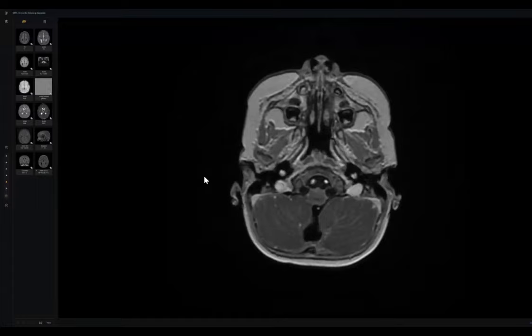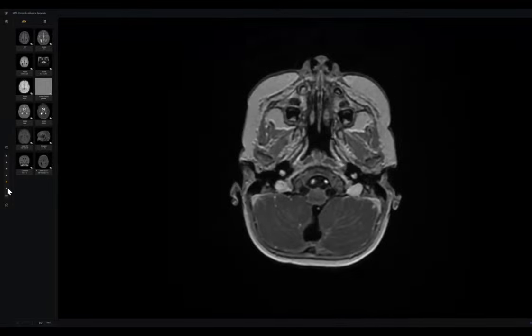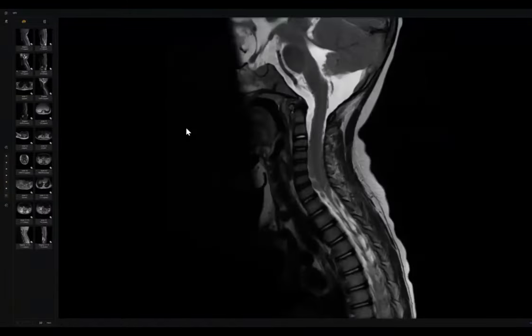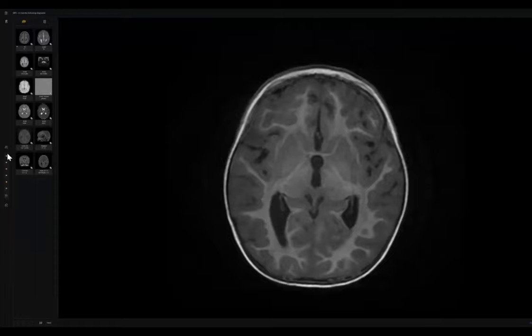LCH. But LCH will not cause this severe leptomeningeal enhancement. In infants there is a condition that comes in the spectrum of LCH, but I don't remember the name of it. Do you think LCH will present without any vertebral involvement in this age group, without any skull lesion? I will show something here to help you.